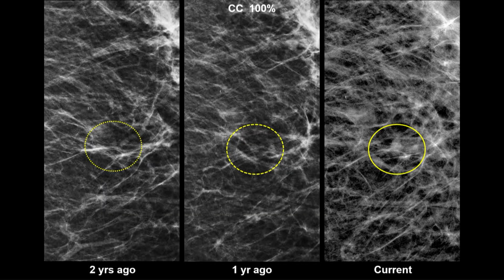I just moved it over to the side like that. I was playing around with Photoshop and did that. And here are the priors. So here it is. Looks like it might be an oval mass if we were to see it on another view. Here, maybe. Here, even less maybe. So it looks like it either is a one-view finding that wasn't there before, or maybe it's something that's growing.